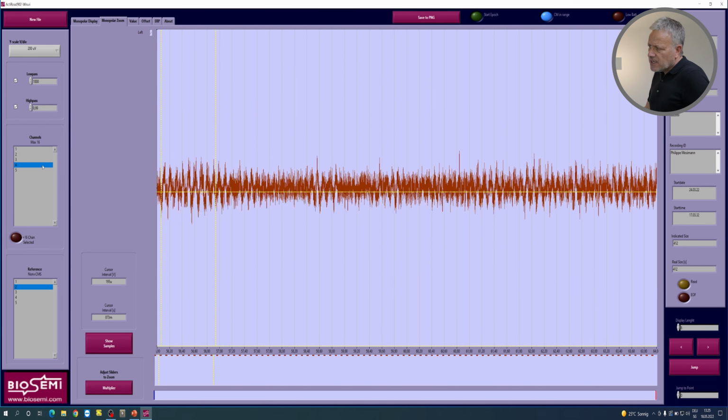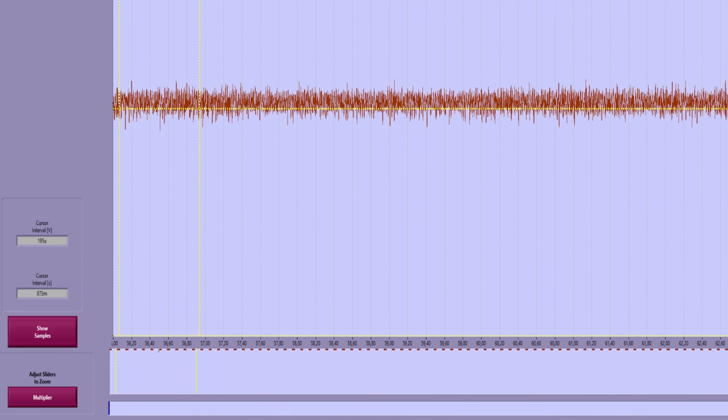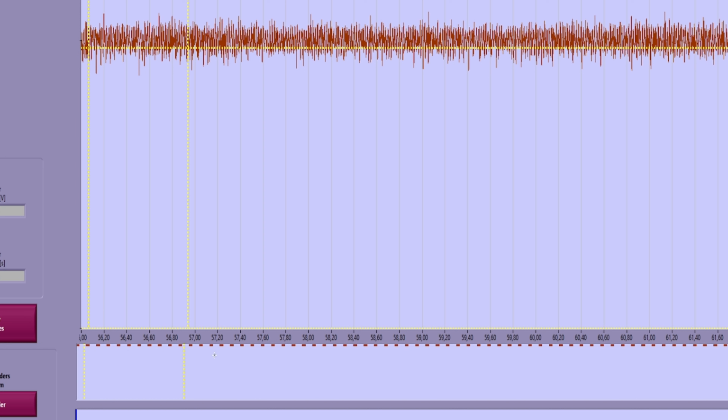So let's just click on channel 4, which is the left channel. That's in fact the channel that we stimulated using the Surpass clicker. When we click here, well, let's just remove the reference because, like I said, this is a bipolar channel, even though it just says left, but this is referenced to REF. On the bottom, we can see the brown little ticks. These are trigger markers number 1.